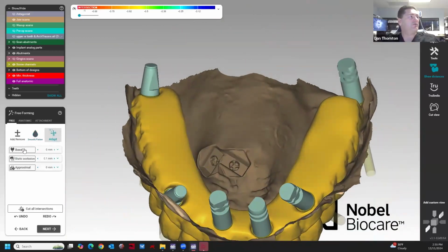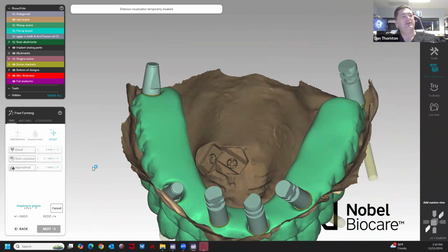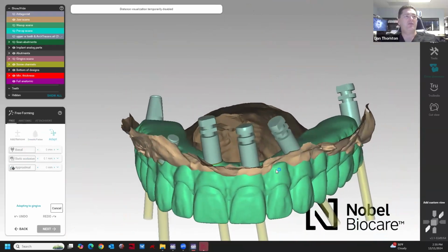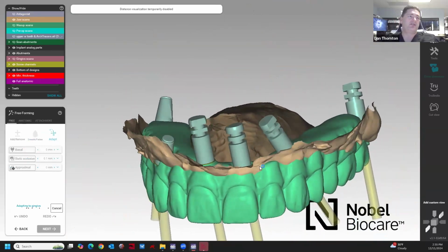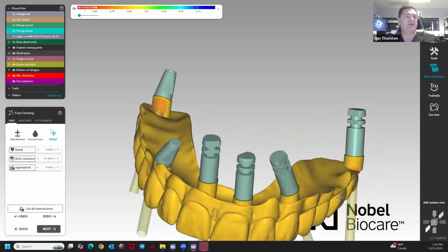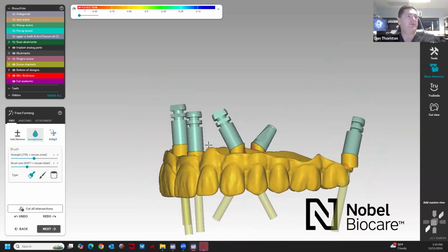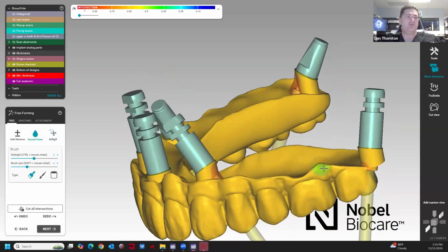You can also do the adapt to your tissue. And you only do 0 at first, just to see where it cuts out. It gets rid of a lot of the other areas and then you go back in and smooth it out. Because certain areas, like on this number 10 area, it's going to be nice and sharp right there. It almost made a horseshoe, which is something you don't want to do in these kinds of cases because you make nothing but a food trap.